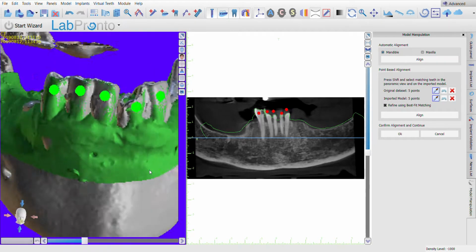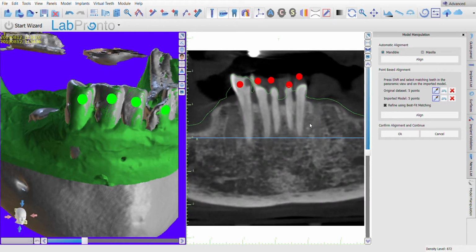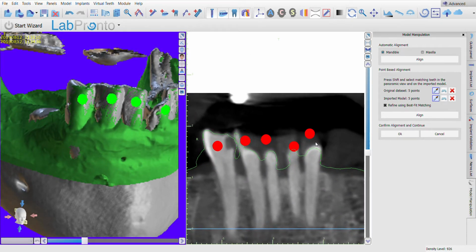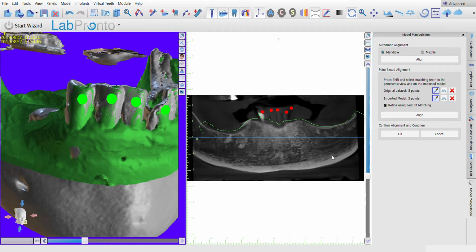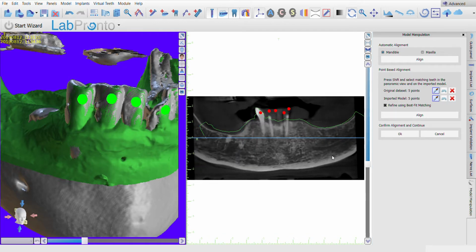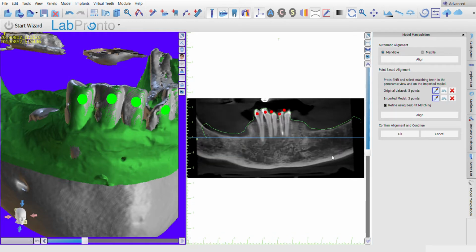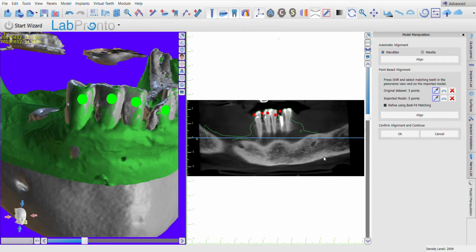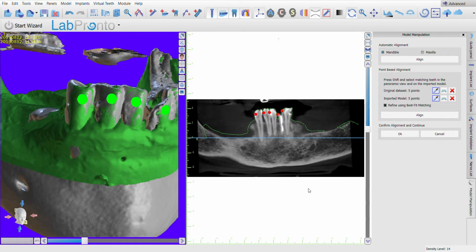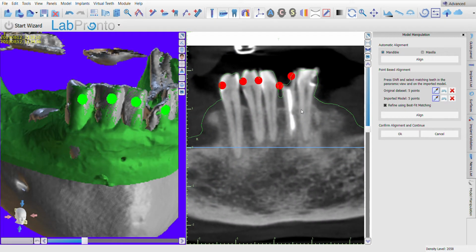Okay, so you come over here and you can follow this path, and I can scroll down on different images. I want to show you what I said about a fractured tooth. Maybe this slice would be a good slice. Let me maximize it.